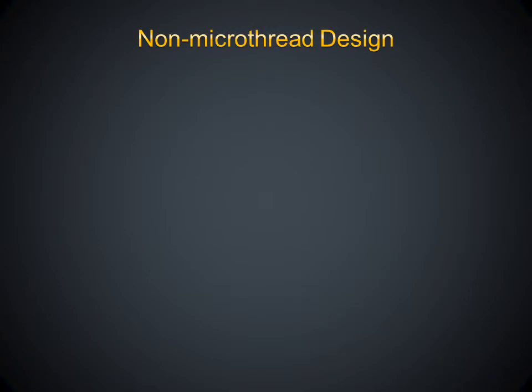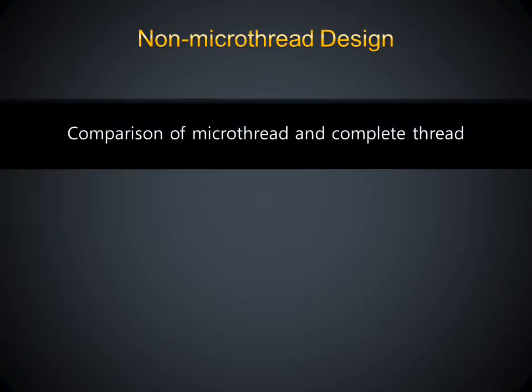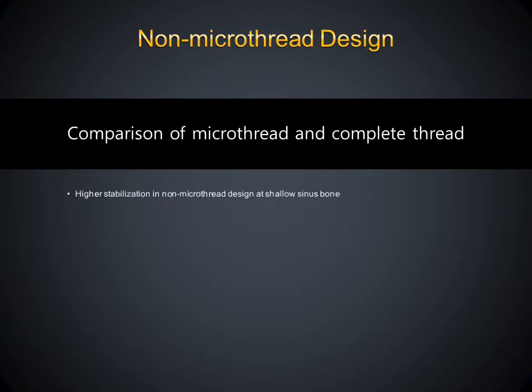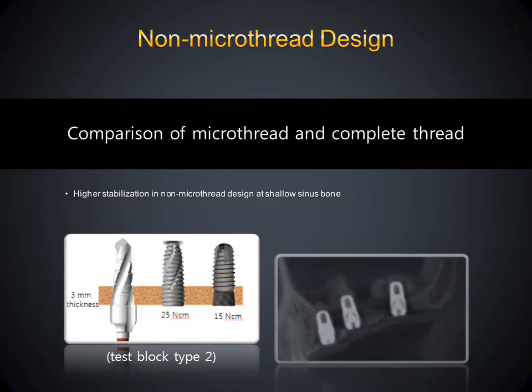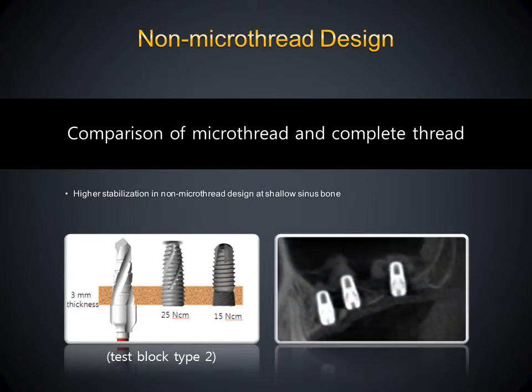Submerged internal connection implants are classified into microthread and non-microthread designs according to the crestal thread shape. The advantage of microthread design is thicker wall in the connection portion than non-microthreads. The disadvantage of microthread design is lower stability in shallow sinus sites than non-microthreads.